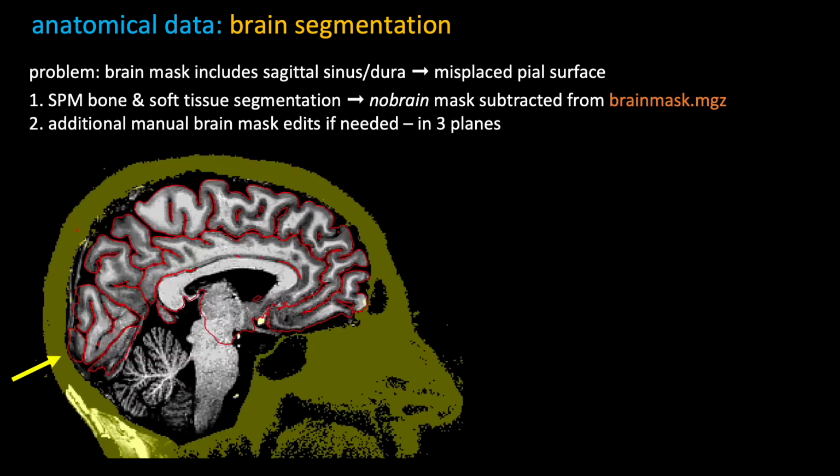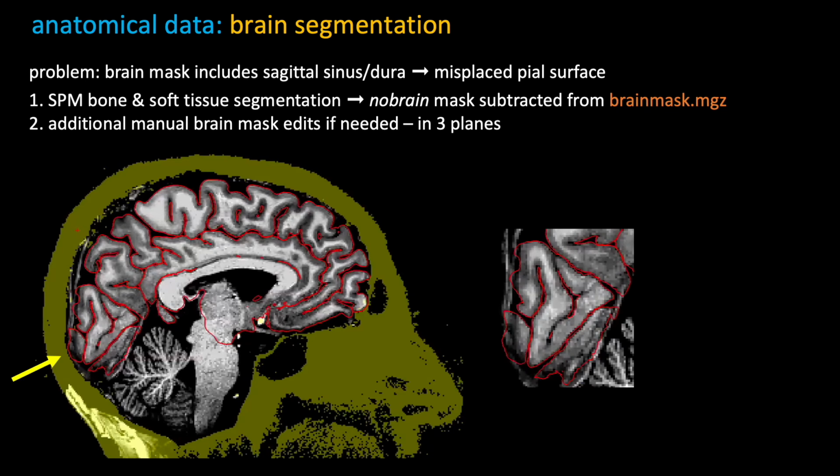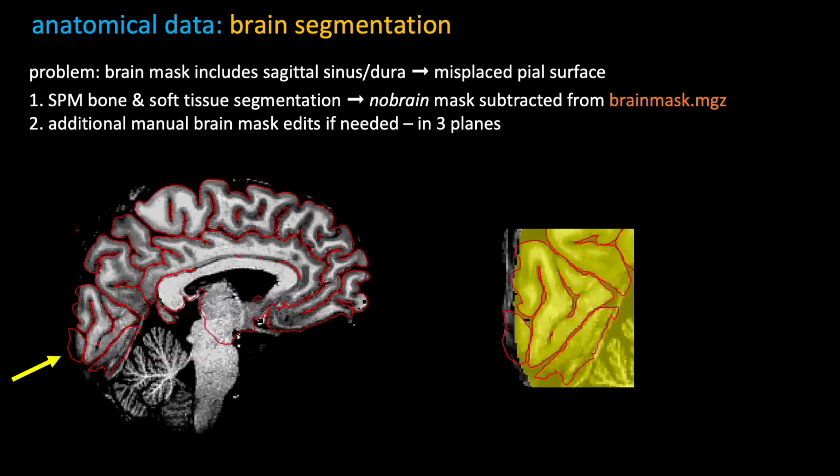So our last resort approach is to correct it manually. So what we do here, you can see it better on the zoomed-in piece of the brain. We actually limit our mask to this yellow mask, as you can see. And this is a version for the whole brain.